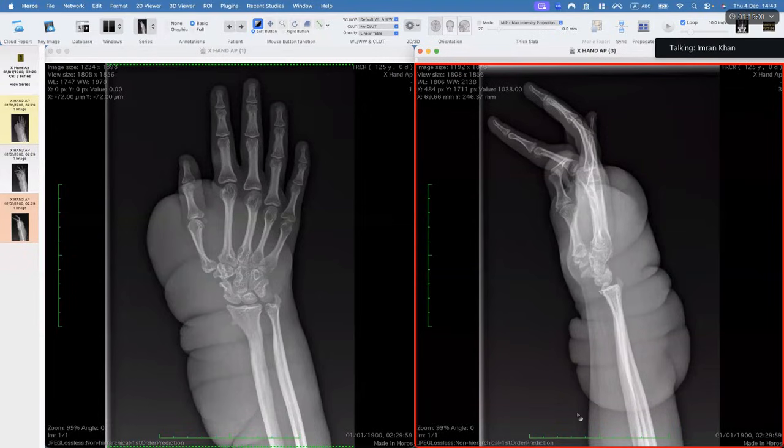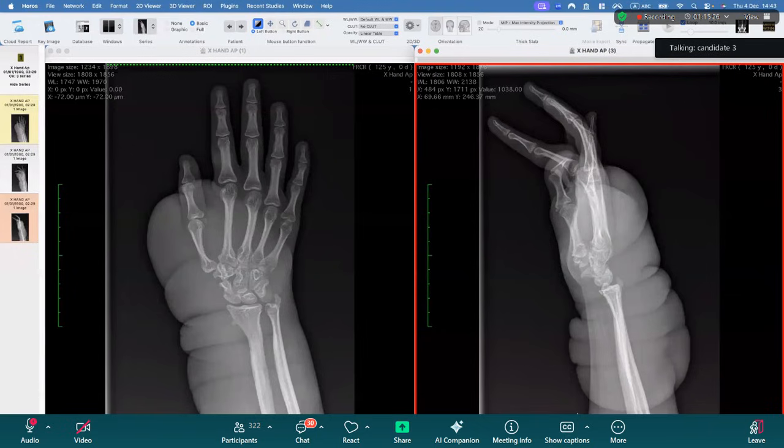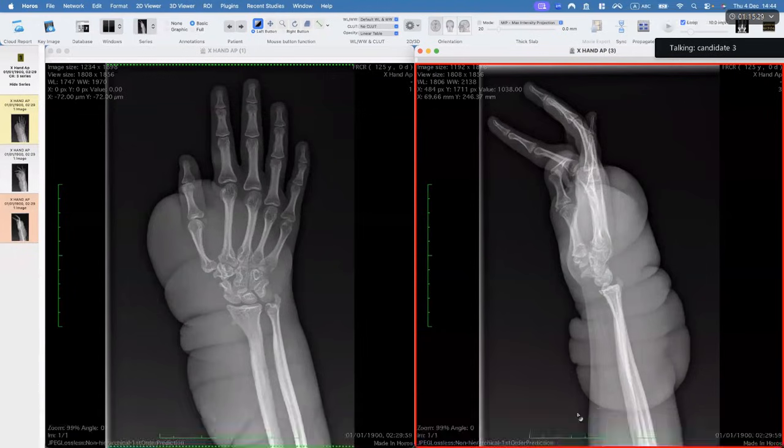And the second question, and this is me trying to teach you some things, not discount what you're saying. Do you think it's reasonable to say that there is scalloping of the bones in this patient? Yes, there is scalloping of the bone, and scleroderma can cause it on the distal parts of the hand, but the skin will be tight, not edematous. So I excluded scleroderma.